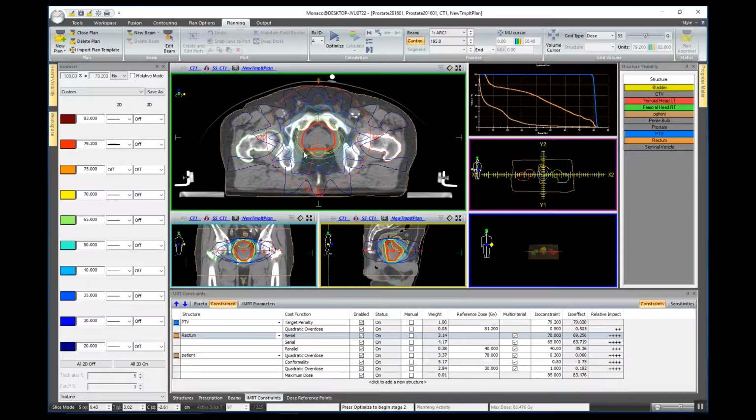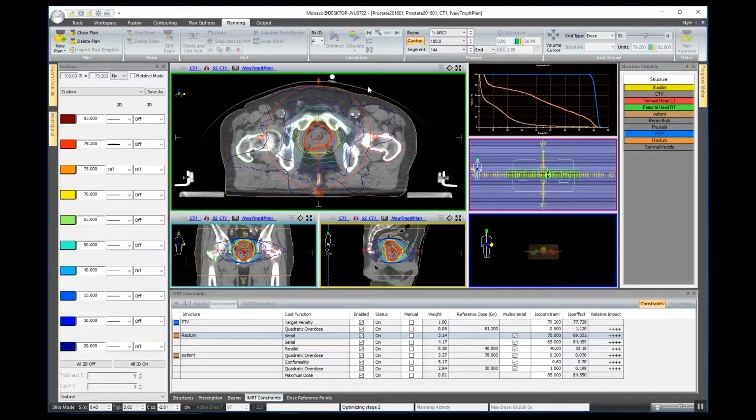As we continue stage 2 optimization, which is where Monaco applies its Monte Carlo dose calculation and segment shape optimization, which allows Monaco to modify segment weights, shapes, and provide highly efficient delivery sequences, VMAT plans, maximizing the delivery capabilities, in this case of Elekta's Versa HD Linac.